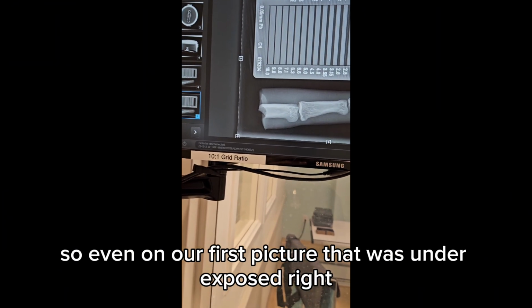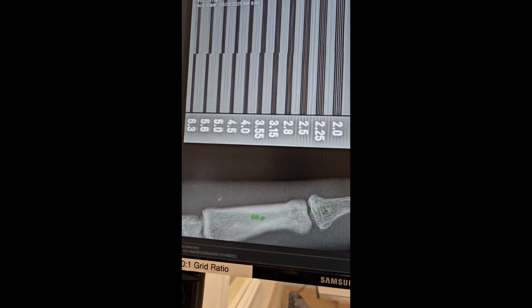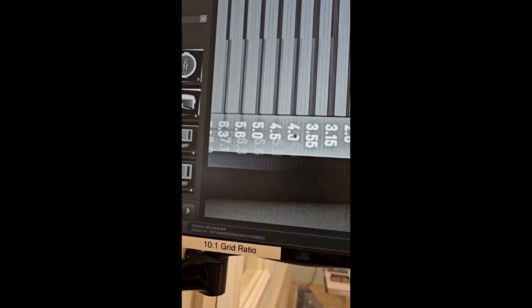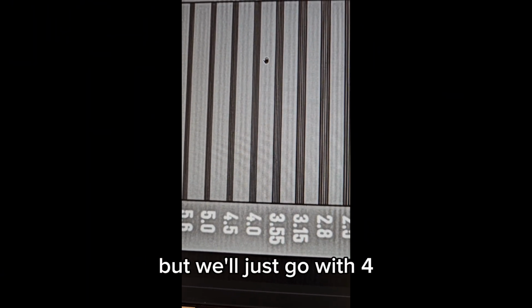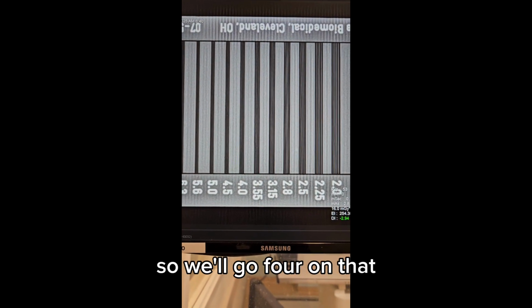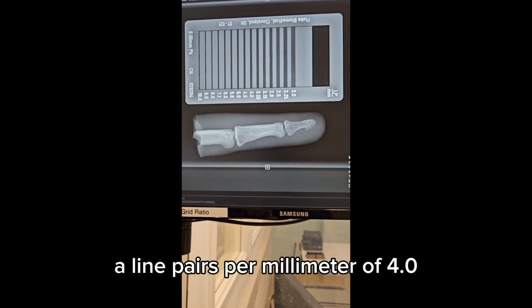So even on our first picture that was underexposed, the -3, if I were to zoom in real good on this guy, even though it's underexposed, it is still the same line pairs per millimeter, still the same spatial resolution. I'm going to still go with 4. I can still kind of see 4.5 again, but we'll just go with 4 because I'm sure this isn't recording as well as I can see it. So we'll go with 4 on that, and we're going with 4 on this. So every single one of these pictures had a line pairs per millimeter of 4.0.